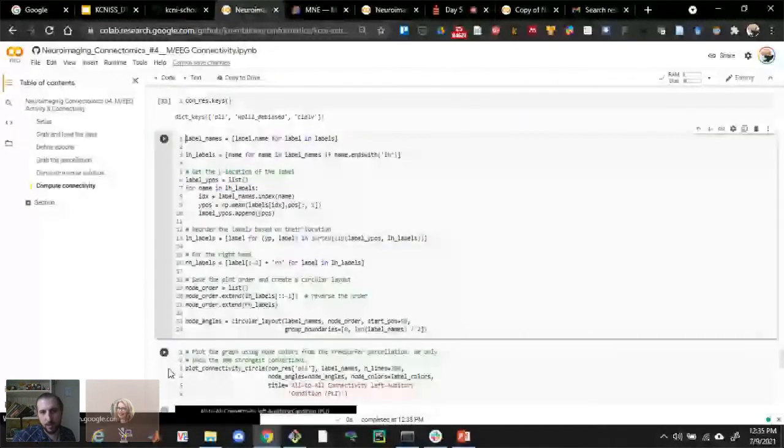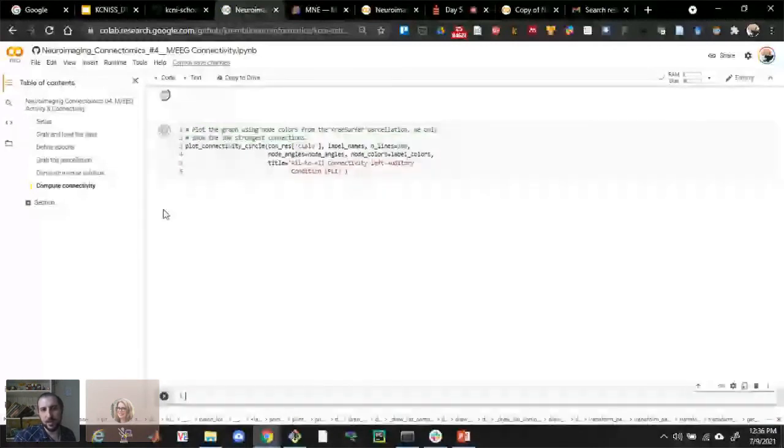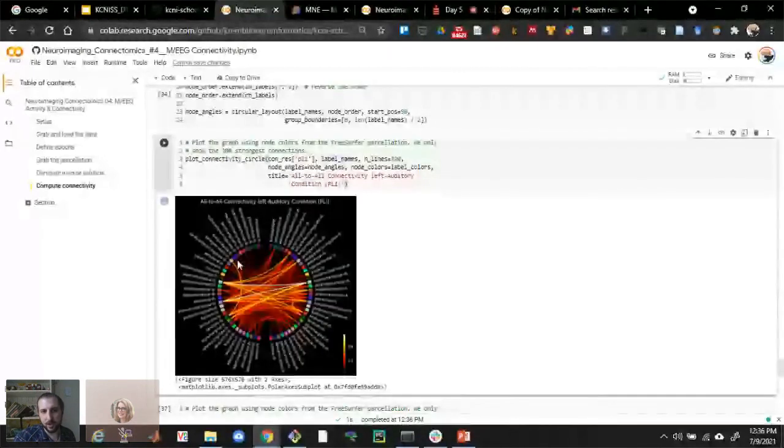So we're just going to do one final thing and then wrap up. Is just alternative plotting for each of these, but we'll just take a look at one, which is to arrange them on a circle. This is just a nice tool within MNE. Arrange them on a circle, left hemisphere and right hemisphere, and do a plot here.